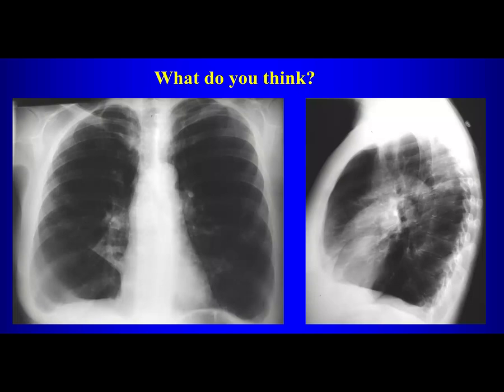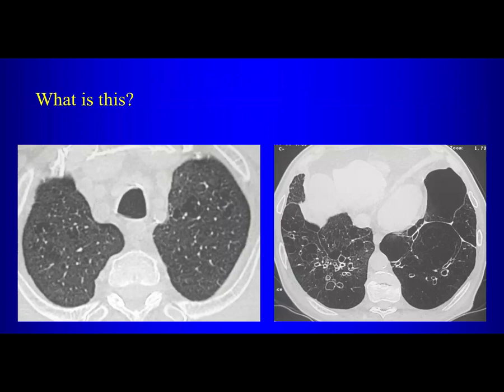Well, let's see. So does the patient have emphysema? Yes. Okay. How do you know? There's bilateral apical bullae formation. Okay. Well, these are not bullae. These are areas of emphysema, like central lobular emphysema. Down here, bullae, right? What is this? Peribronchial thickening.